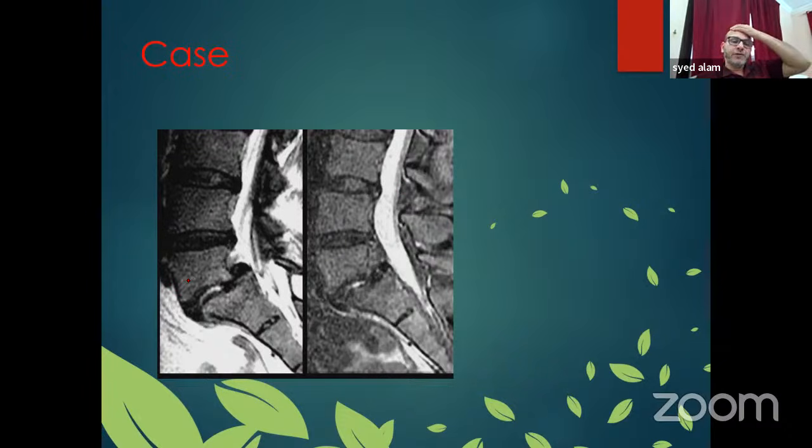Okay, this I intentionally put because most of the time people think of discitis. But fluid in the T2 bright disc is not discitis. Why? Because see, the end plate is maintained. So this is just degenerative changes that can also cause disc bright signal. So this is not infection. This patient has mild spondylolisthesis. That's the cause of degenerative changes.